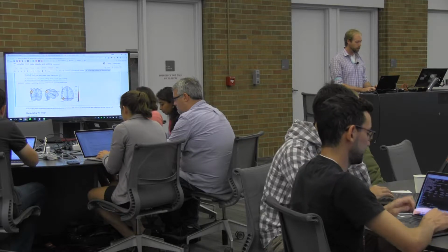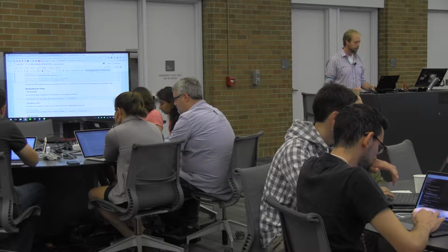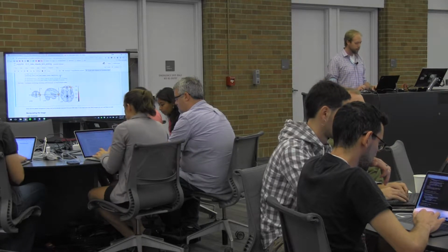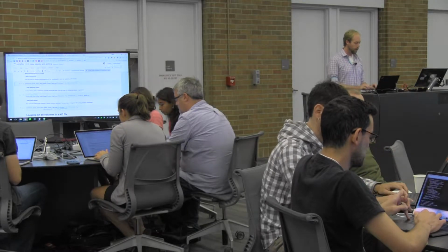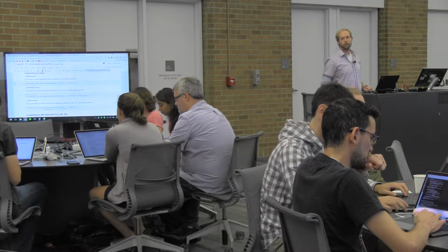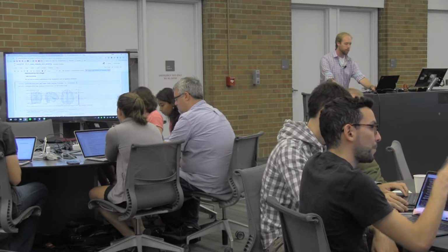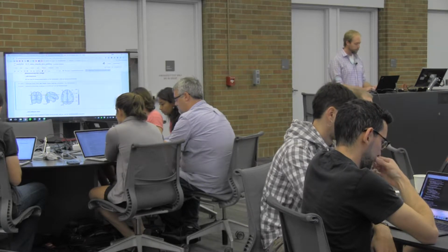So we could easily look at some of the other parts of this atlas if we just change this index right here. Now I'm going to look at the 6th region. I can look at the 10th region. That's a way that you can very quickly, interactively scan through the data that you've got here. You can perform different operations on the plotting itself. Something that's very common if you're doing a statistical map like a T-map is to threshold your image. For that, you can supply a threshold parameter here, and this will only plot things that lie above whatever threshold you give.